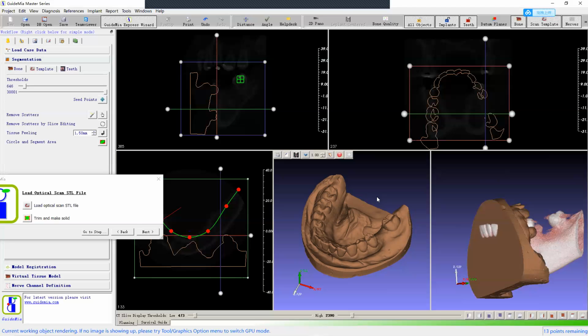Then the software in the machine can do interpolation, and then they tell you the value is 0.2. So they double the size. But actually, the native, physical value is only 0.4. And they tell you a higher resolution by a mathematical approach.